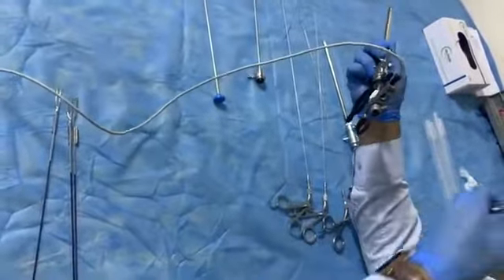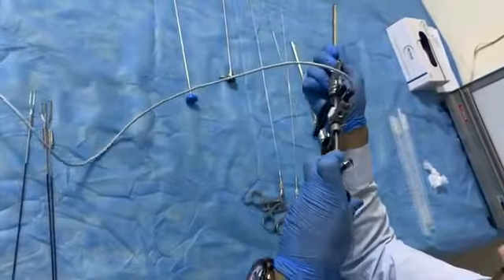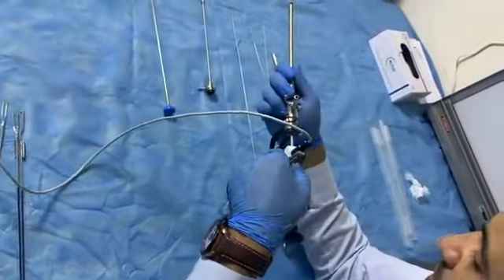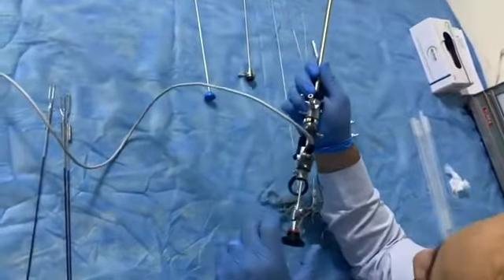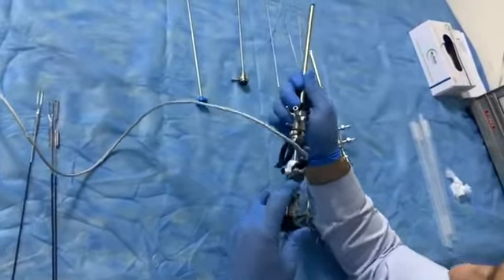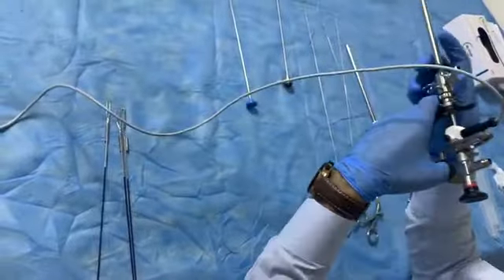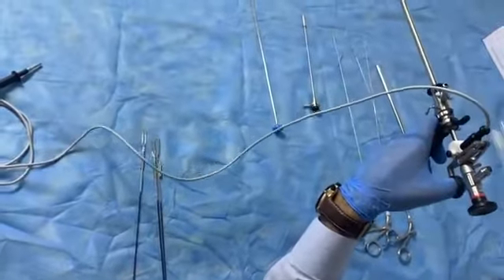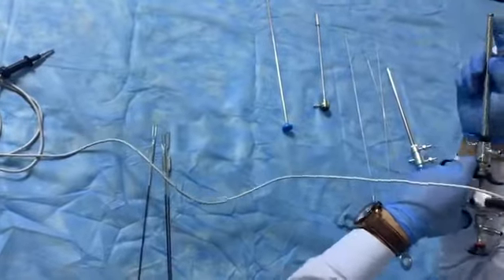And again we will pass the telescope from here. Also this line should be parallel to this line. And there is a notch in front of it, and clockwise to close. So it is ready to work now. And we look to the monitor, suppose the monitor here or here, and we will do my work from here.